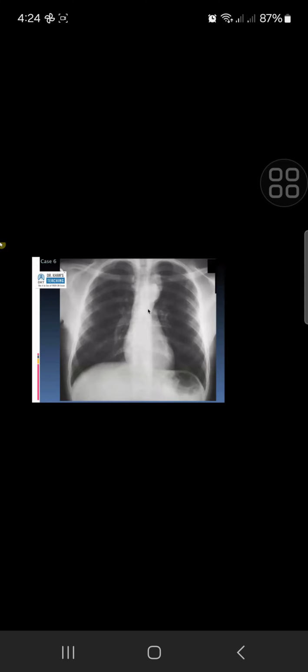Yeah. That makes sense. So try to look for minor changes in the rib. And if you look carefully, the lateral margin, actually, you can see that it's a little bit visible above the upper margin of clavicle.